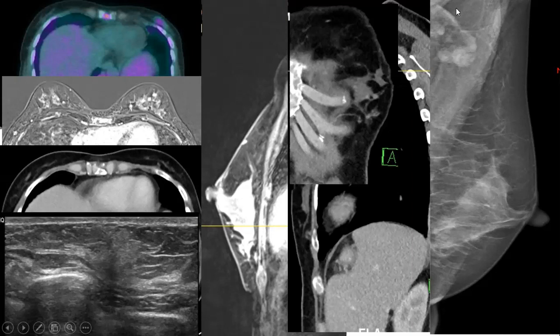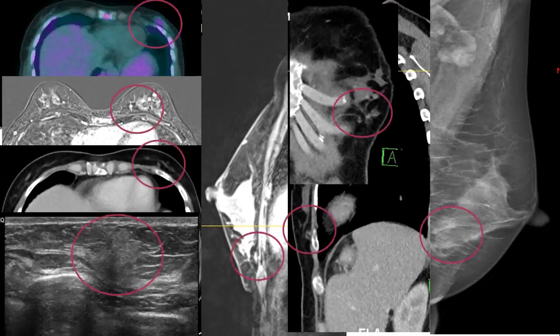This is a metastatic lymph node still having an abundant fatty hilum because the metastatic deposits were in the cortex, not yet growing to obscure or infiltrate the fatty hilum. So this is a very tiny lesion presenting with extensive bone metastasis, but fortunately, she has no metastasis in the lung, liver, or ovaries.